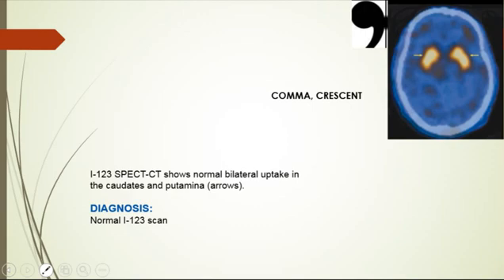If there is decreased uptake in the basal ganglia and the caudate and the putamen, this indicates a Parkinsonism-like or Parkinson disease, which might respond to dopamine treatment. So it will change the whole treatment plan. It's not a very simple thing.